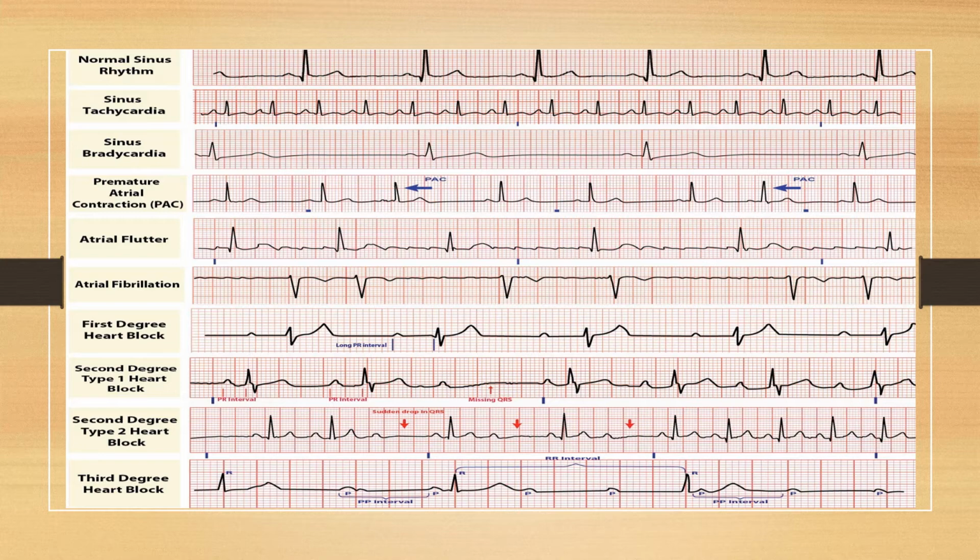Sinus bradycardia. So let's see why. This one's super slow, by the way. Let's go to the second one that has a QRS because I can't see the P wave on the first one. So is there a P before the QRS? Yes. And then go to the next one. Is there a P before the QRS? Yes. So this is sinus bradycardia at an unbelievably slow rate. I'm not going to calculate it, but it's definitely less than 60. So it's sinus bradycardia. Okay, so notice we're just doing the rhythm.